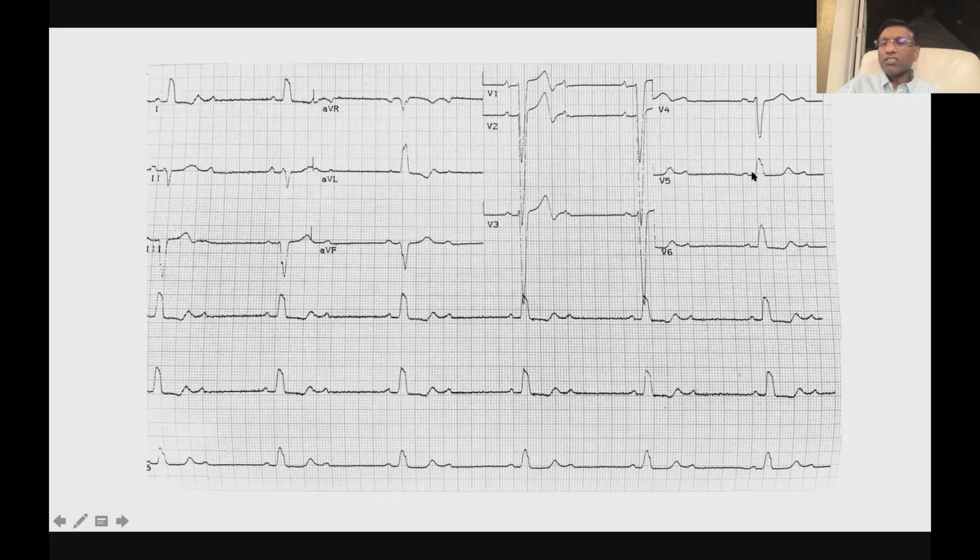You have loss of Q wave. Look at this, V5 and V6. Normally, there's a little sharp Q wave followed by QRS, and in these, this is lost. I'm down to the last 1 minute of our time together here.